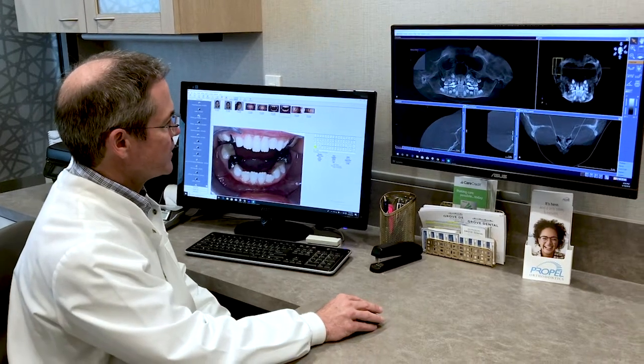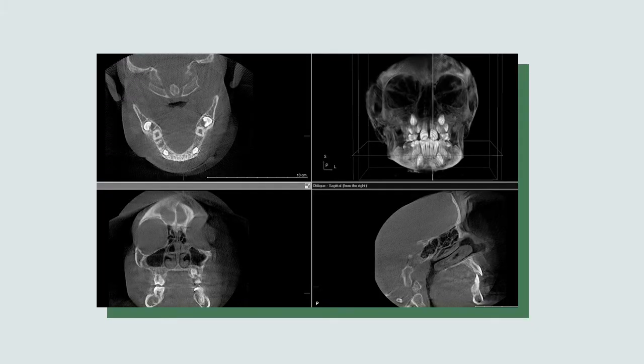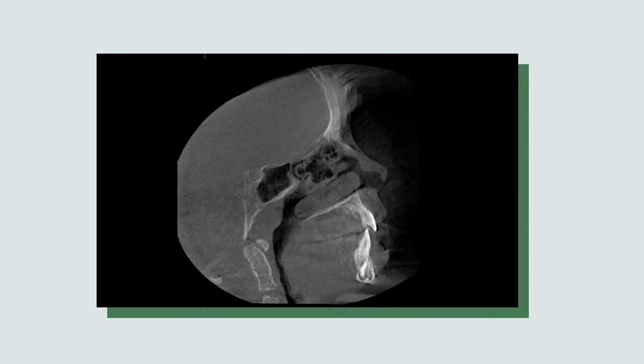The next thing is, especially because of our questionnaire, they snored, so I'm going to look at tonsils and adenoids. We look right here, and this is a slice going right through the middle of the head. This yellow line depicts where we are on this bottom screen. If I get this about the middle right here, I can look, and that airway is pretty narrow. About right in here are the adenoids, down in here is where the tonsils are, and up in here is where the tongue would be.